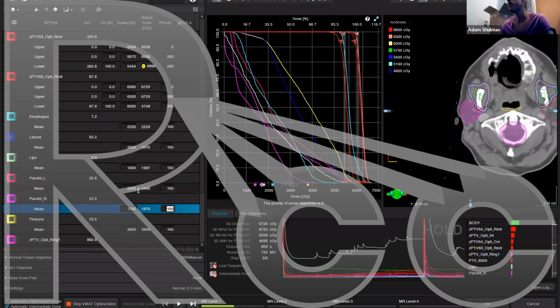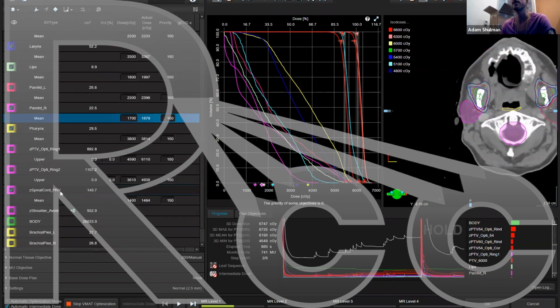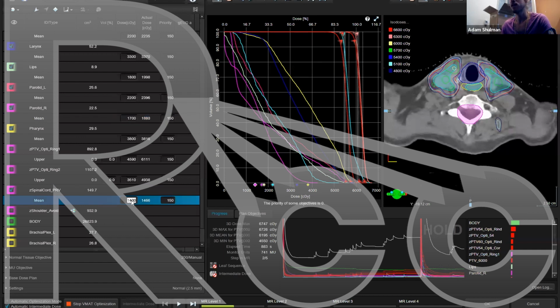Again, if your doctor was willing to sacrifice PTV coverage, you could always implement the ZOAR in PTV technique. And again, I'll refer you to the last video. You can always glance at your rings. This looks about the same. If you turn it on, looks about the same as where we started. Same with ring 2. Looks about the same on the DVH, if you're curious. The spinal cord is cutting close to achieving it, so we'll drop it maybe 3 gray more.